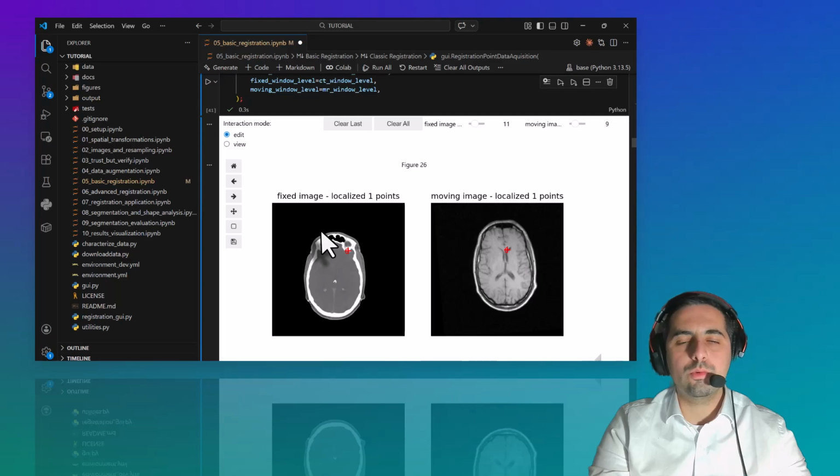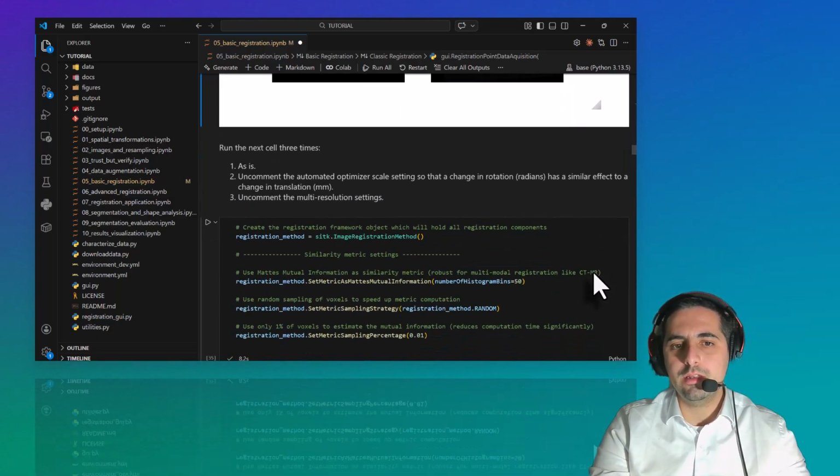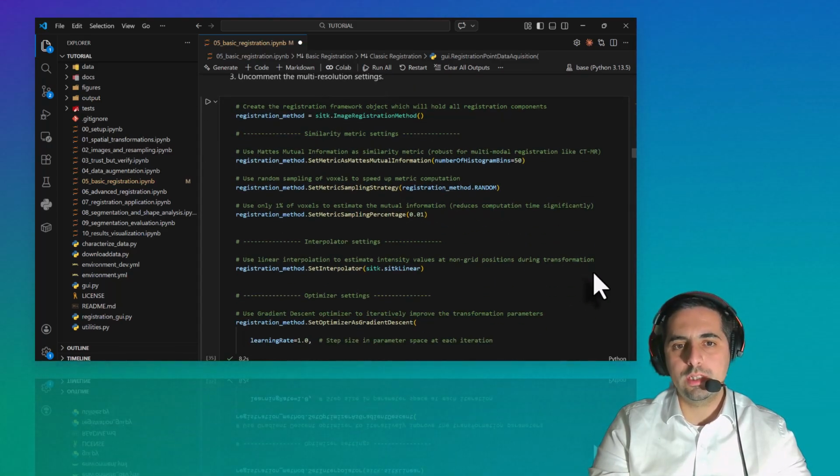What I expect to see here is the exact geometry of that, but because I haven't performed the registration yet, it's completely acceptable not to have this. So we need to go ahead with the code and then get the correct parameters. Just to summarize, we got only the translation parameters from a basic subtraction between the centroids of the two volumes, and now we are going to get the true registration.